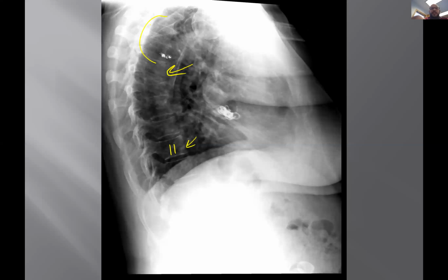I admit that you can't see much of anything up here because of obliquity of the end plates in relation to the X-ray beam. You would need a spot view to look for abnormalities up there. Okay, so that's the finding. There's slight anterior wedging of T8. Okay, diagnosis, everybody. Unmute yourself. Someone shout it out. Compression fracture. Okay, good, good.